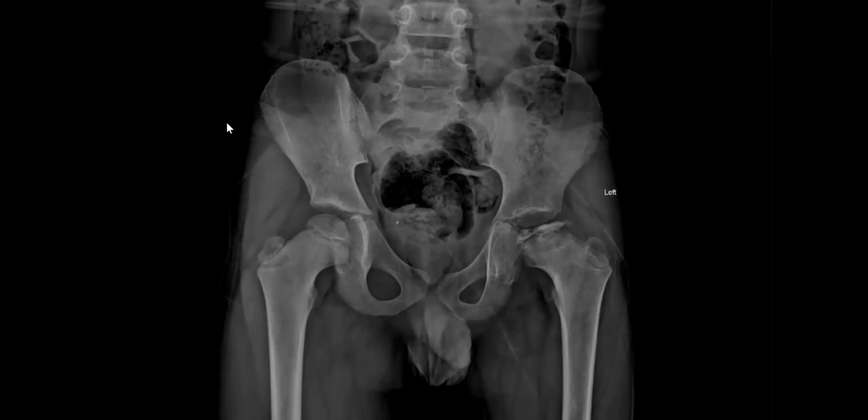This is an X-ray of the pelvis, frontal projection, of a skeletally immature patient. I can see sclerosis and loss of height of the left-sided femoral head with flattening of the femoral epiphysis. Findings are likely in favor of Legg-Calvé-Perthes disease. However, I would like to know the history of this patient and review any other orthogonal views if available.